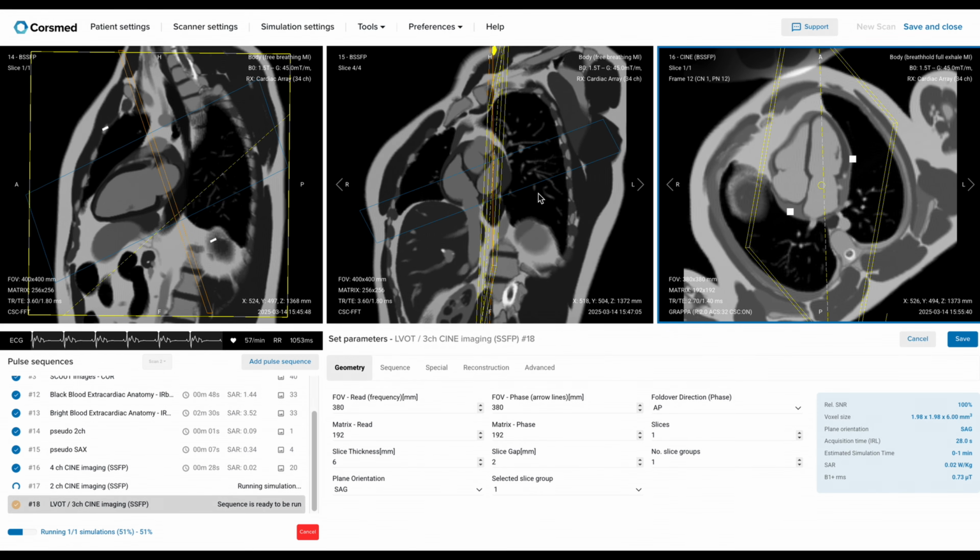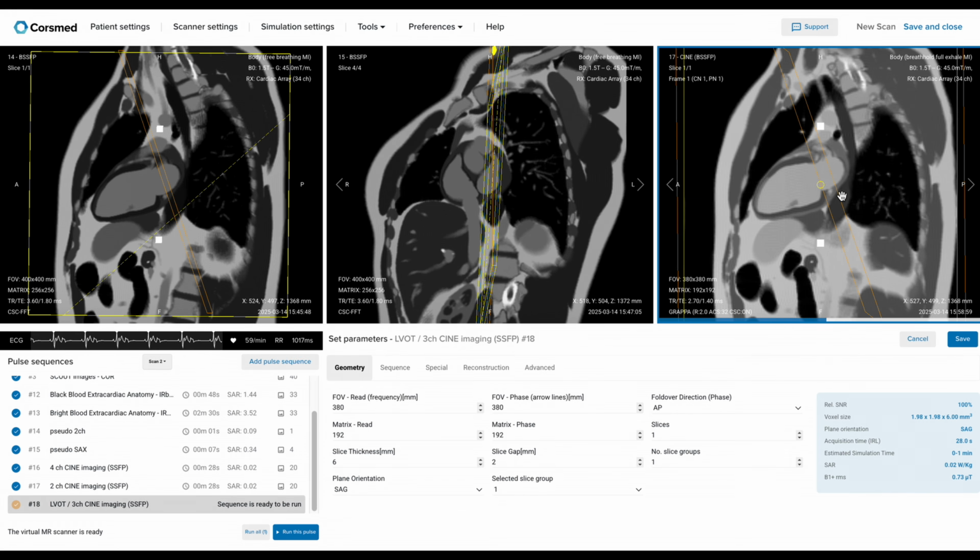This technique uses phase contrast or velocity mapping, and it measures flow in both the aorta and the pulmonary artery. In a healthy patient, the flow ratio should be 1:1. What comes in should equal what goes out. But in some diseases, or when there's abnormal communication between the heart chambers, like between the atria or the ventricles, this 1-to-1 ratio doesn't hold.